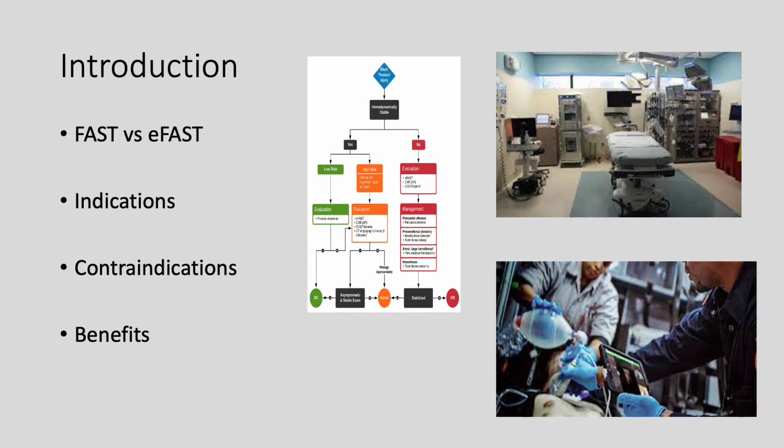Ultrasound is easily accessible in the trauma bay, inexpensive, and non-invasive. While not as accurate as a CT scan, an EFAST exam is widely considered the best initial screening modality in trauma over DPL and physical examination. However, there are still limitations to the exam.